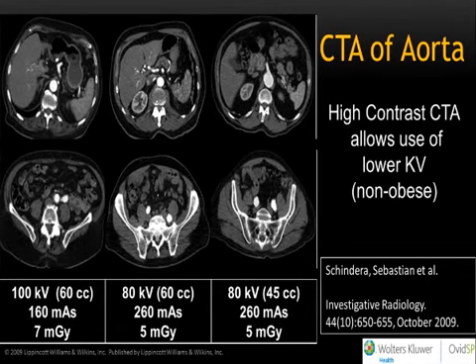So what they said was, because you're going to inject contrast, which is typically 4 to 5 cc's per second, they used 3 different types of protocols, and they assessed what can be achieved with lower kV. There were 2 things that they were clearly able to achieve. One is, clearly at 100 kV, their dose is about 7 milligray, which is roughly 40 or 50% lower than what you would have expected at 120 kV or with a routine abdominal CT in an average size patient.